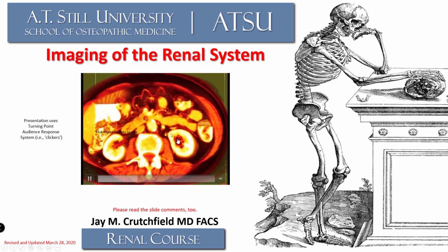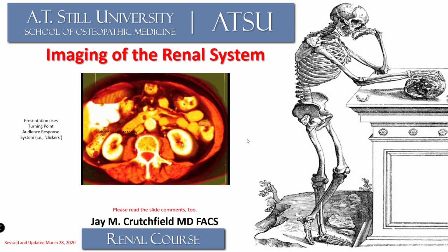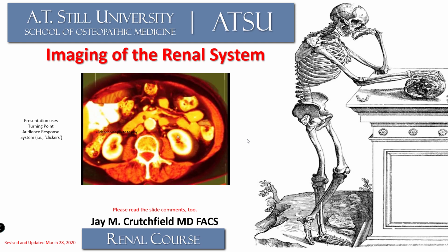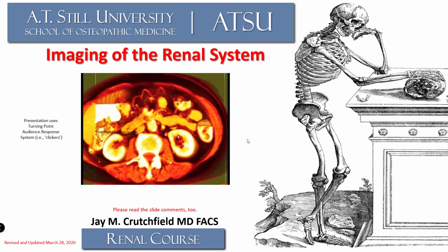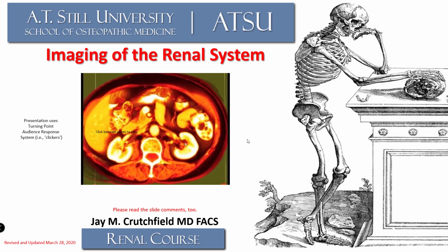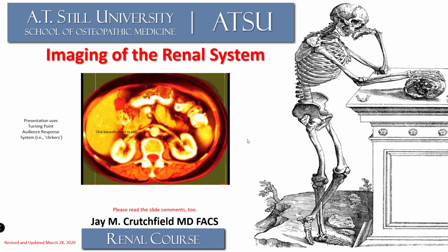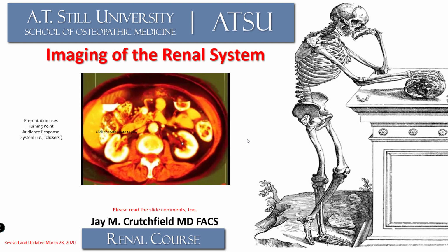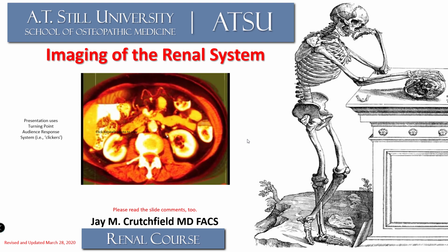Here on the initial slide, we're just scrolling through a CT scan using BodyViz, looking at the kidneys in the retroperitoneum. And I'm just simply showing some of the anatomy here in the retroperitoneum as we move up and down through the kidneys, looking at not only the renal vasculature, but in this case, we can see the renal vein, the renal artery, we can see the renal pelvis, etc.